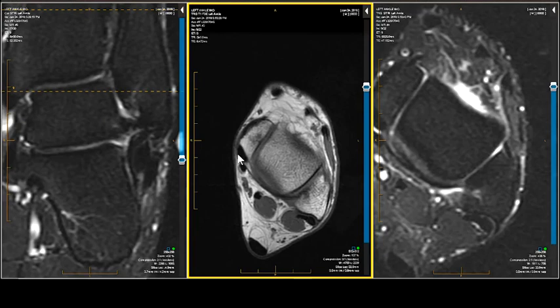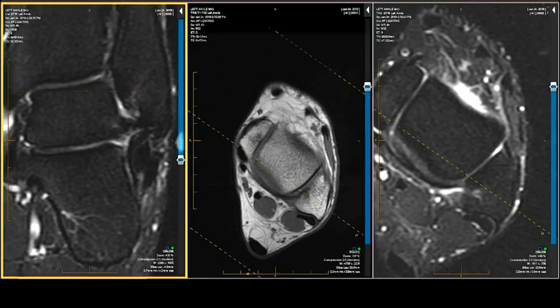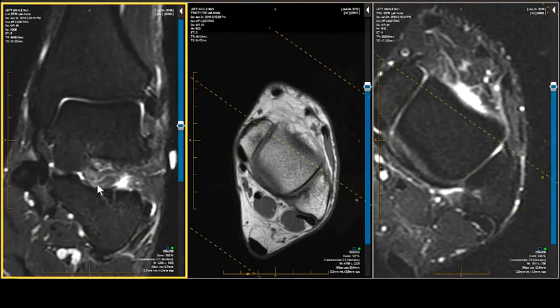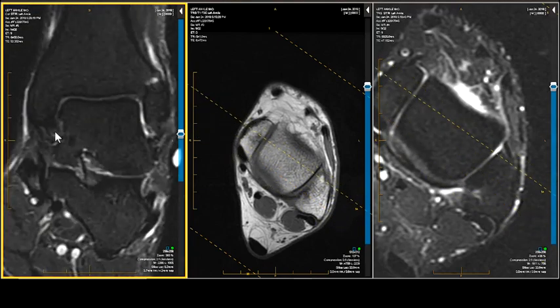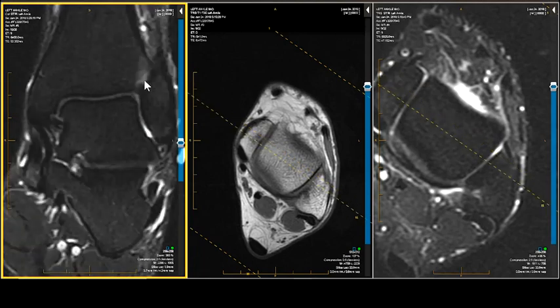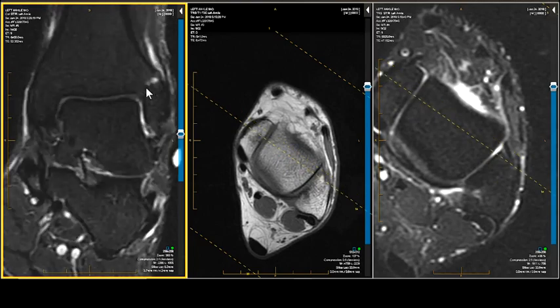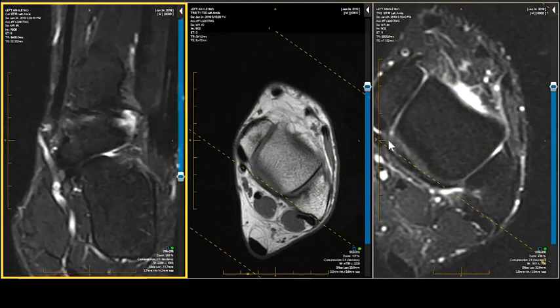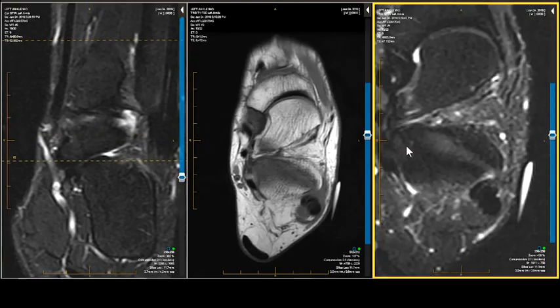The PT, that's okay. How about the deltoid? That's part of the ankle sprain search, even though we never operate on it. That's okay. What about the talar dome? Is there an OCD? Nothing of consequence. How about an occult fracture?